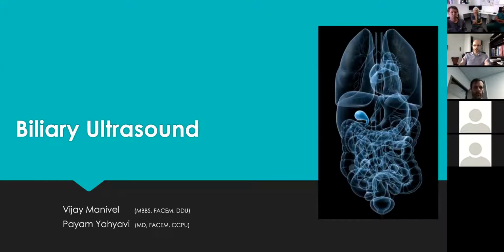At the end, there are 10 slides which are mostly pathologies, that I might keep as a discussion. Each of you gets to describe what you see and the pathology, and how you would describe it in the exam situation in the Viva exam, if they include these sorts of images.